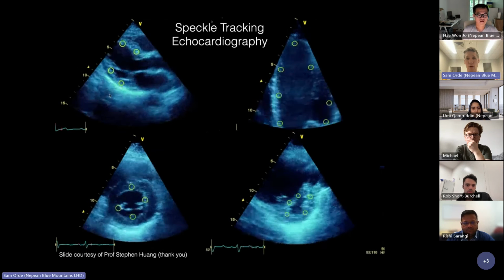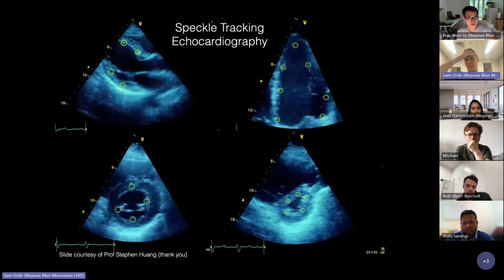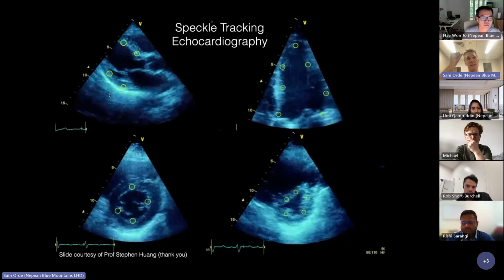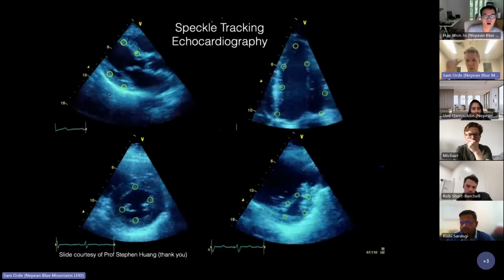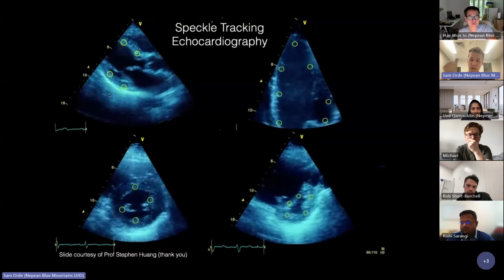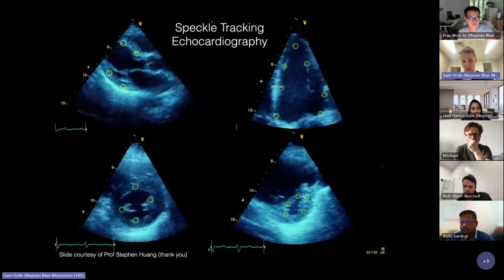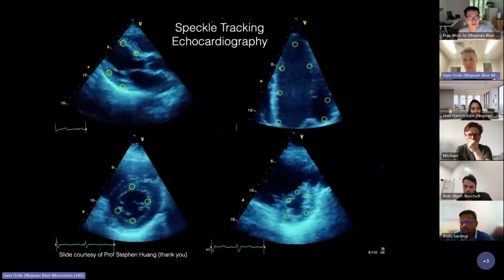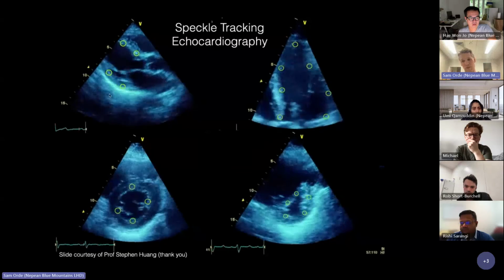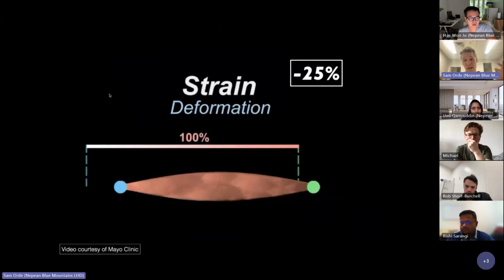Okay, really quick, we'll talk about some speckle tracking and then I'll move on. So speckle tracking is a new software from the last decade or so, where these little speckles that make up the myocardium, if you look at tiny little sections of them, we call them kernels, and they're like a fingerprint. They don't actually change over the cardiac cycle, and they're made up from constructive and destructive sound waves bouncing off each other. So they've got a unique appearance in different parts of the myocardium, and then the software latches onto those and watches how they move during a cardiac cycle.